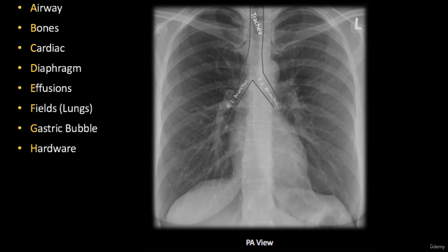The other pathology which can change the normal picture of the trachea may be a growth, a tumor, or enlarged lymph nodes. If they are severely enlarged, the trachea could be pushed from the midline to the right or to the left. The same is true about the aortic arch. By the way, if any aneurysm or dilation of the ascending aorta or aortic arch is present, that may cause deviation of the trachea from the midline.